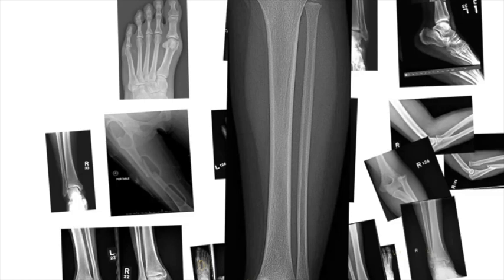And it'll look like a lucency, which you can see here, this line that kind of comes down like this. See this lucency through the bone, and those are vascular channels. And you can see them in almost any bone. There are some classic places like the tibia, and you shouldn't mistake them for fractures.